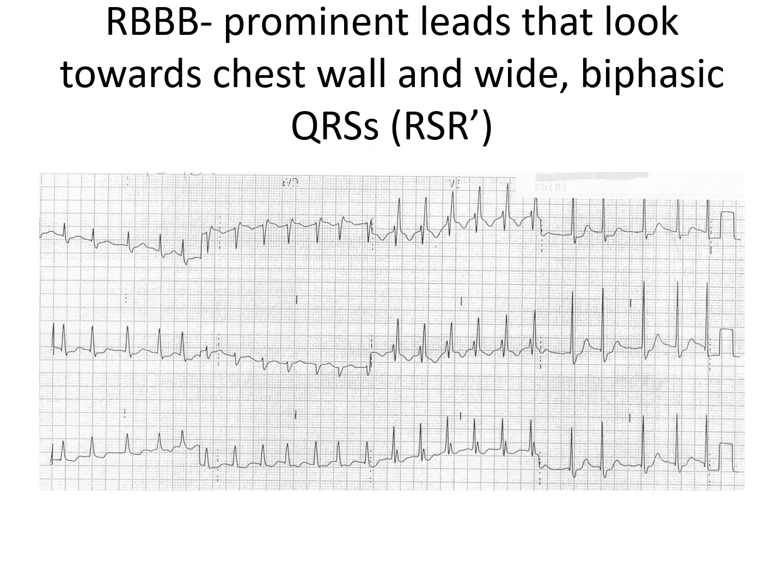What's happening here is just like in the left bundle, it's a superimposition of the two vectors. The negative deflection is the LV depolarizing very, very quickly in the middle of the slowly depolarizing RV, and the LV is depolarizing in the opposite direction, so it produces a negative deflection superimposed on this big, broad, upright QRS produced by the right bundle. And this is pathognomonic for the right bundle. Also note that a second peak is higher, and that also is pathognomonic for the right bundle.